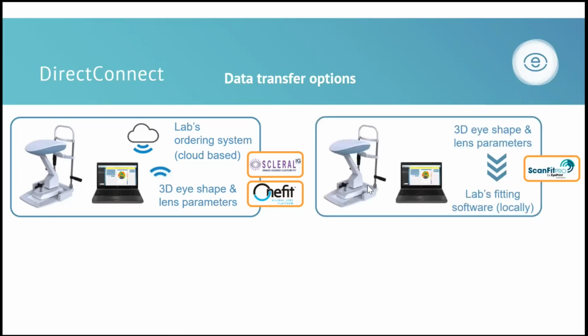So for the ScanFit Pro, they don't have an online platform, but they have a locally running program. So when you click on Direct Connect, that program will open within your computer. And again, also there, you will keep on giving the instructions you were giving until now.